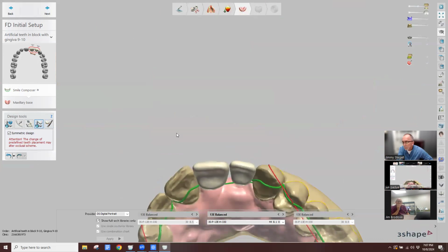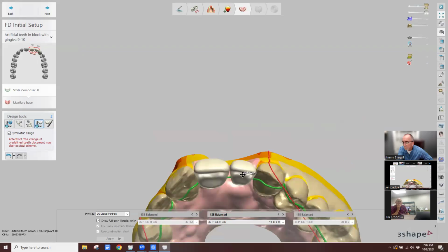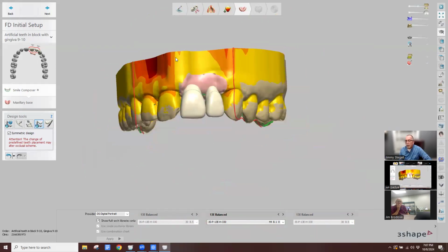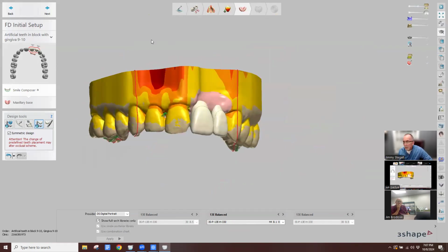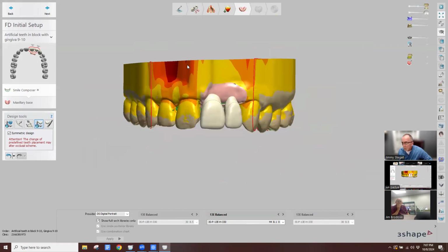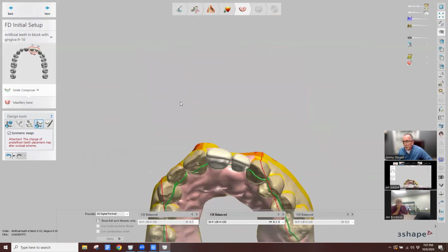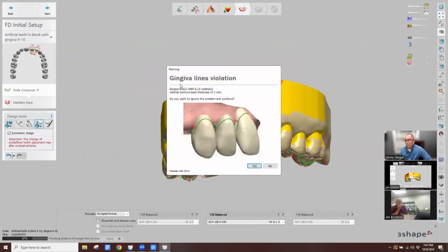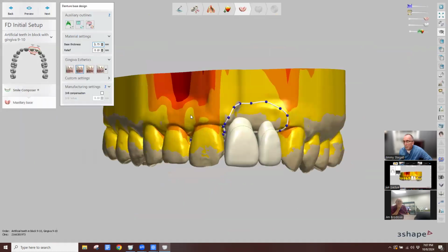All right, it's not perfect, but I think it's established I'm the most okayest technician there is. But talking about workflows here, so let's just say I'm happy with the mold, shape, and position, and I'm ready to go. Always get that error, ignore it, move forward.